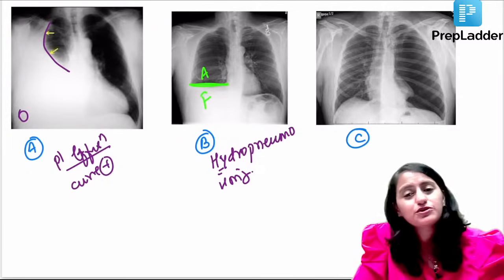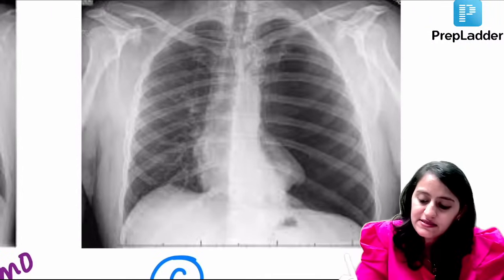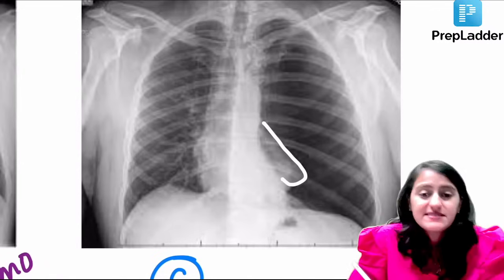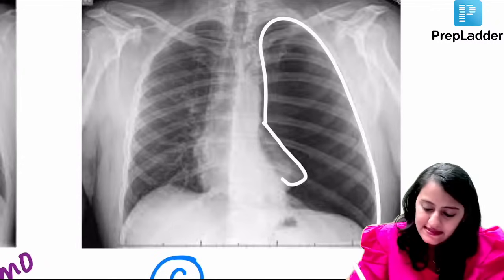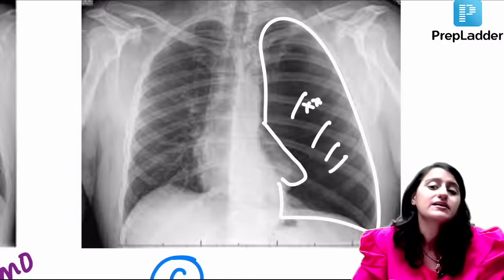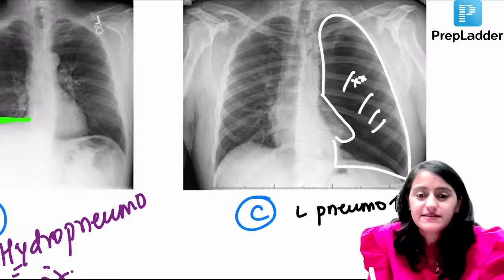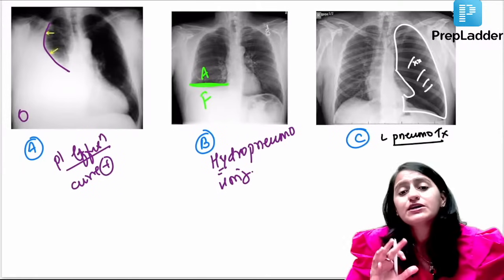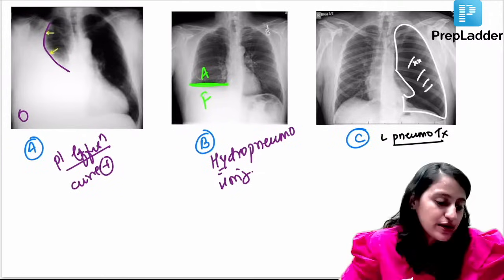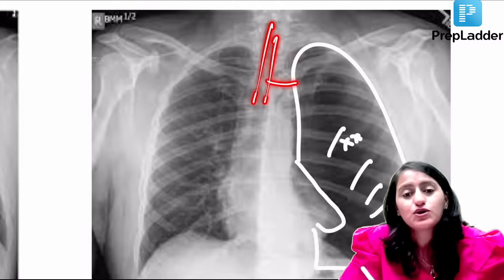And in this one, where do you see pneumothorax in this image? Right side, left side, where is the pneumothorax? So the left side. This white that you are seeing is the collapsed lung, and this entire thing is the black pneumothorax. You are not seeing any vascular markings, right? The white is the collapsed lung. So this is the left-sided pneumothorax. Pneumothorax will not show any vascular markings. Normal lung has the blood vessels going through it. You can see that the trachea is also getting shifted to the opposite side when it's a severe pneumothorax.